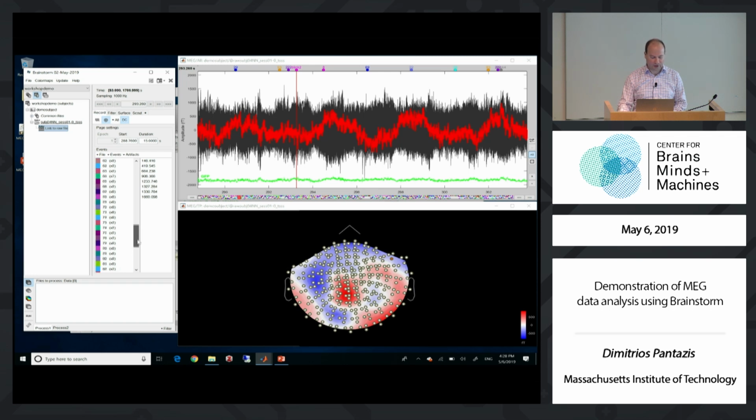That was a topic of another study. What I want to do is collect all the stimuli corresponding to faces and some corresponding to objects, so I can construct a meaningful contrast. And I know that images of faces were coded from 13 up to 24, so I will collectively select all these codes. And what I want to do is call them a different name, call them faces.